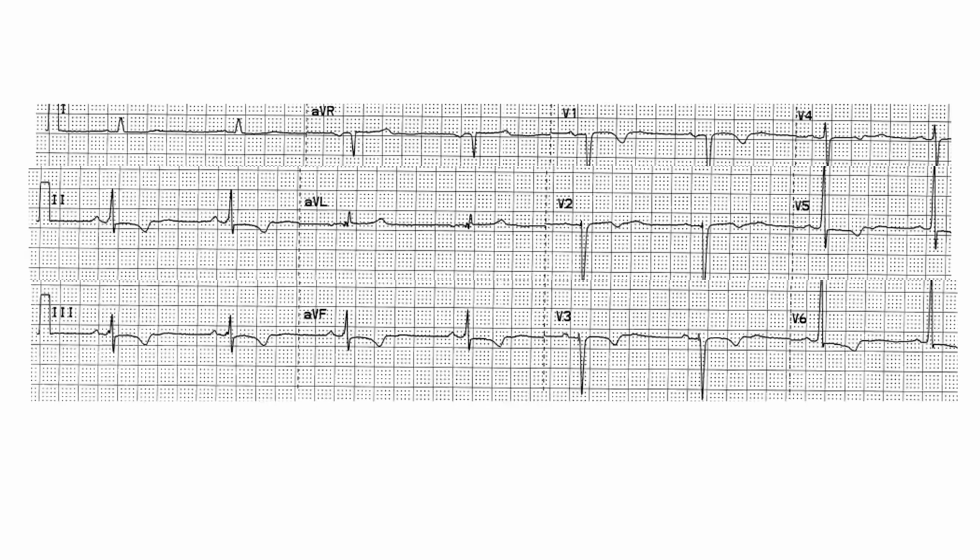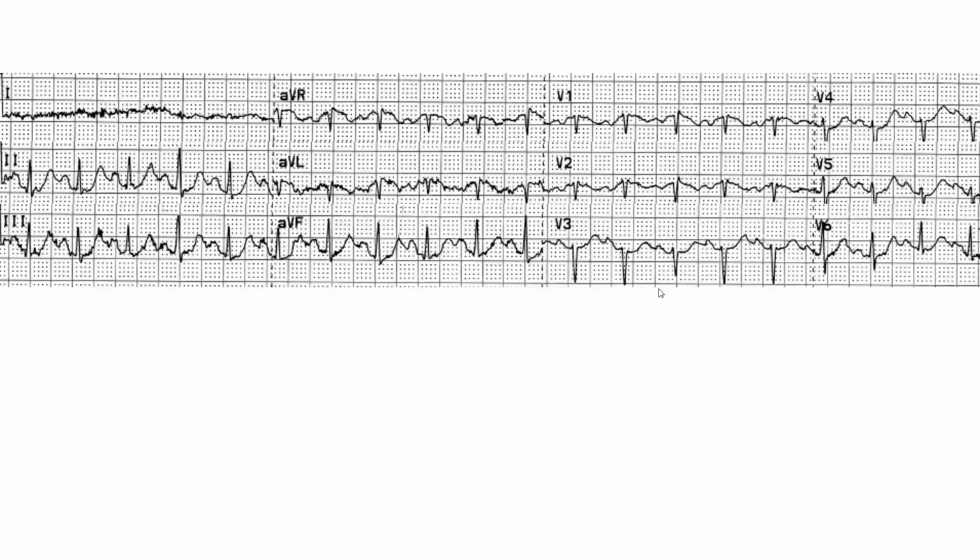This is another EKG. What's the diagnosis on this EKG? So we have poor precordial R wave progression, very small R in V2, V3. Is this MI or not? We have T inversion in V1 through V3, clear-cut T inversion. And we have a tiny R in lead 1, less than 4 millimeters, and a tiny R in AVL. And indeed, this patient did have apical akinesis.